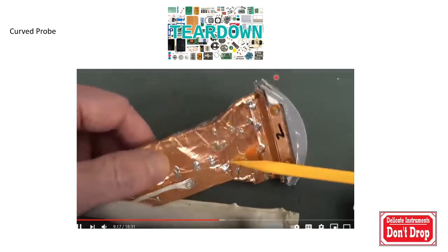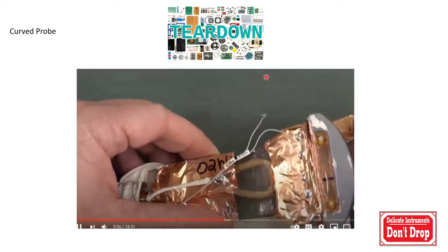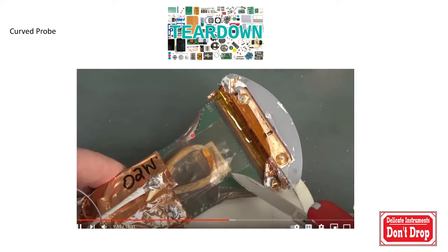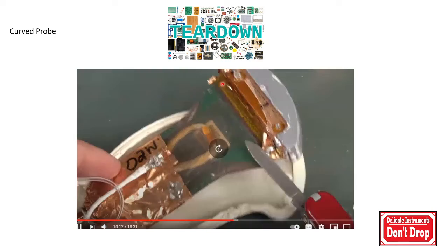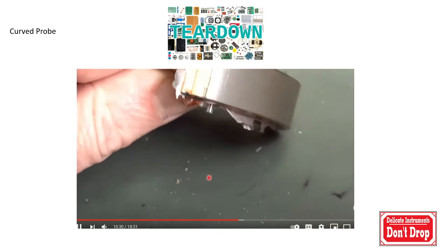And we have to think of a large piezoelectric crystal cut down into very small pieces and fixtures. These are the electrical wires or circuits that connect. The current is passed through this electric circuit.